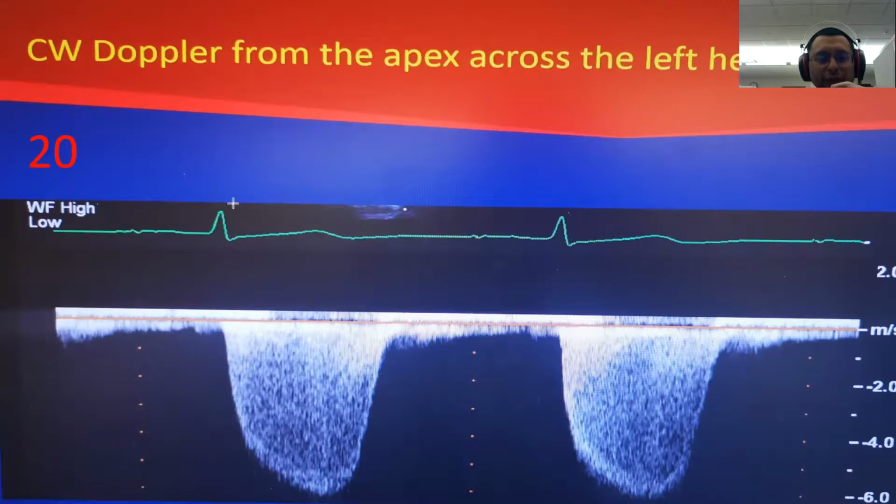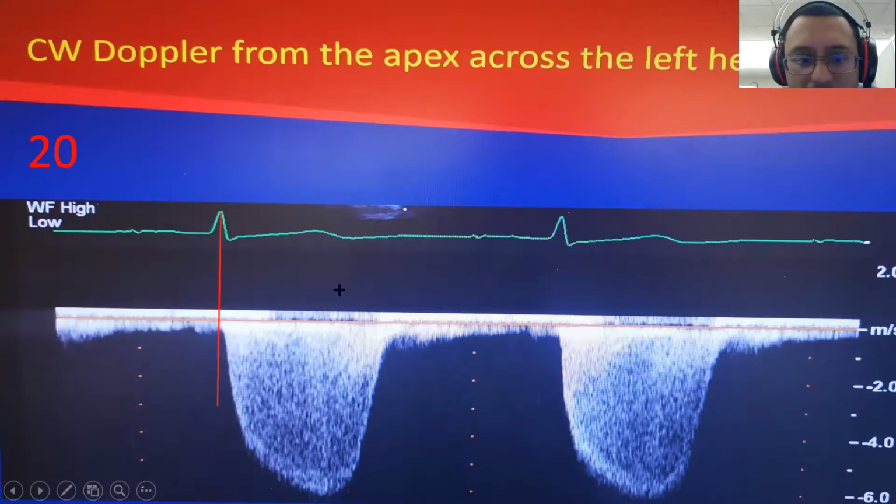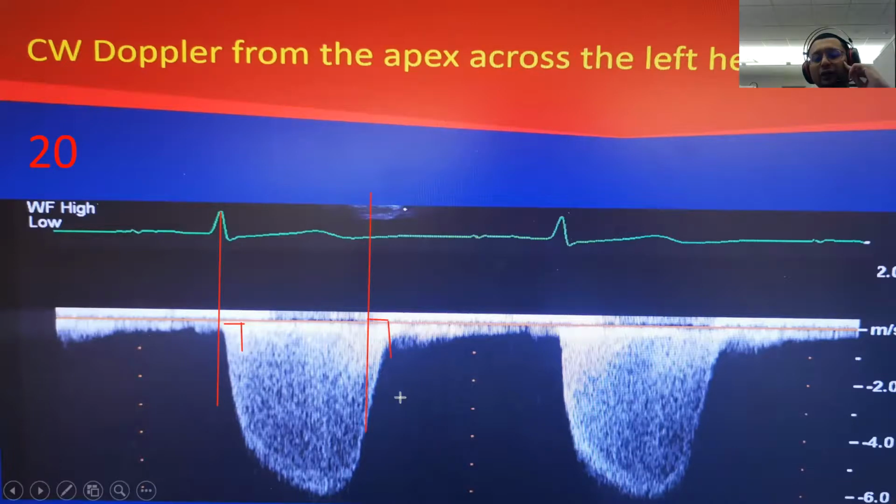I'll show you one of the tricks. So this is the diastole. Now where is the systole? Maybe that is the systole. Now you see isovolumetric contraction and isovolumetric relaxation. This flow also comprises isovolumetric contraction and isovolumetric relaxation. If they have aortic stenosis or LVOT obstruction, it won't comprise the isovolumetric contraction and isovolumetric relaxation. So this is a mitral regurgitation. MR is high velocity.